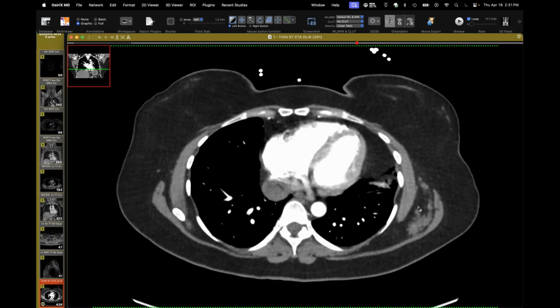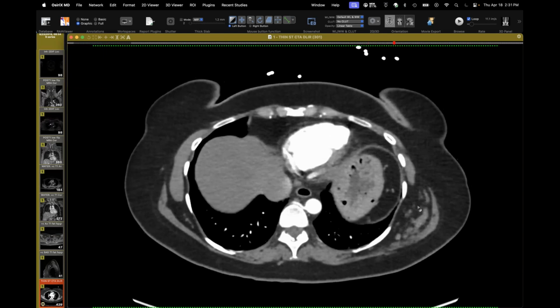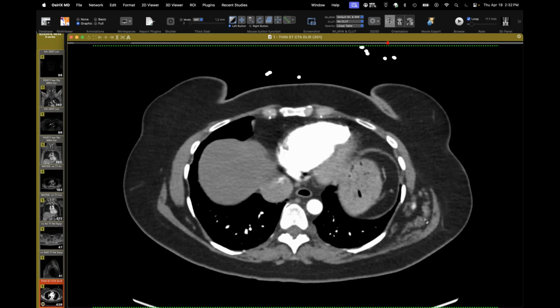So is the fat part of it, Jeff, or is it just? Well, I believe so. Sometimes we call these hemangiomas, and they often have fat in them. I've seen one in the mediastinum, and way back when we actually reported a case, a patient had one in his mediastinum that drained into the pulmonary vein. He presented with a stroke, and so that one, of course, had to be treated. But my understanding is, yes, there is fat admixed in these things, and they often have these little channels in there, and you can see them anywhere in the body.